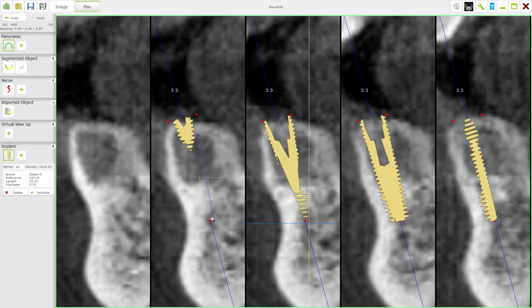Because although the diameters of the drills are, if you like, matched to the diameter of the implants, which we'll look at later, there's certain situations where if the bone is very soft, a D3 or a D4 type of bone, you might not go for the full sequence. So there's 3 burrs needed to take you to a 3.75 implant. You might not go to the last burr for the 3.75, but you might drop back one and use the burr that's intended for the 3.5 or the 3.25 diameter implant. So you drop back a burr size in order to just undersize the osteotomy to give you better primary fixation. Because again, what we want with our implants, you have a higher success rate if you have good primary fixation.